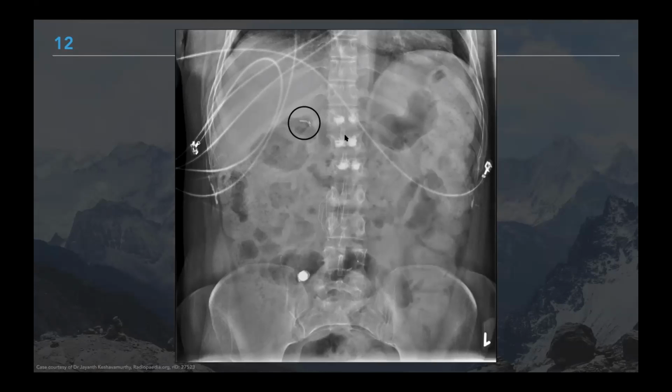So you can see surgical clips in the right upper quadrant. So if you remember, if I showed you a calcified lesion here, you would say it was a gallstone. So this is going to be cholecystectomy clips from a lap chole. Surgical clips, always really important to identify, especially if you see something like obstruction, because then it's going to give you a clue that perhaps it's due to adhesions if it's small bowel, or perhaps they've had a previous cancer operation which has then recurred if it's large bowel.